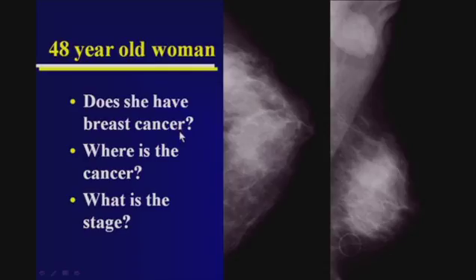So let's take another case. This is a 48-year-old woman. Does she have breast cancer? Where is the cancer? What is the stage? So we'll study the mammogram.